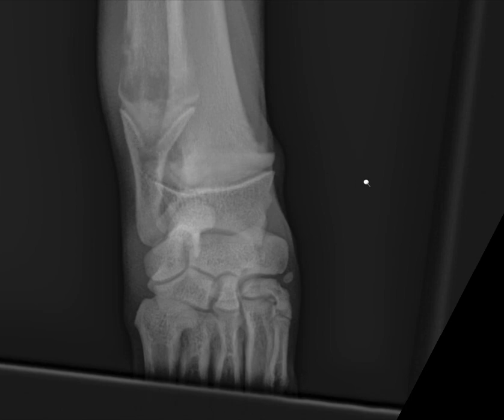So my conclusion after going through the ABCs of this case would be that there's some type of a metaphyseal disturbance affecting the radius and ulna. To talk about the D and S of ABCDs, D stands for devices, which is not relevant here, but is important when doing an orthopedic follow-up, and S stands for soft tissues. You can see there is a little bit of soft tissue swelling here.